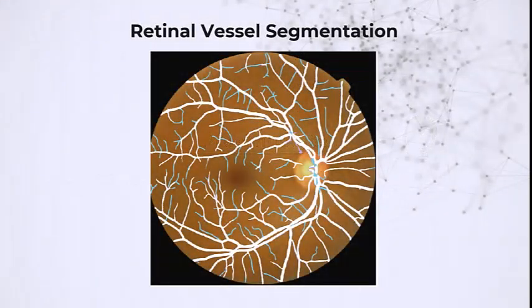Here is an example of retinal vessel segmentation. The white denotes the AI pre-annotated vessel segments. Teal indicates the vessels that were manually added. And purple marks the annotations that were manually removed. The MAPLES-DR dataset is now a key asset for eye care research and diagnostics.